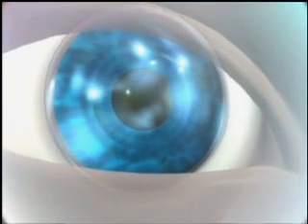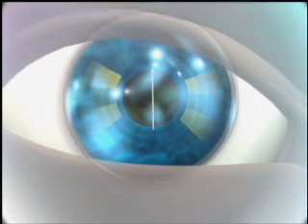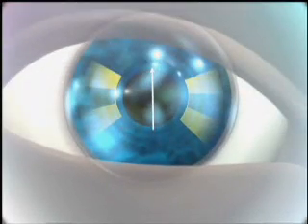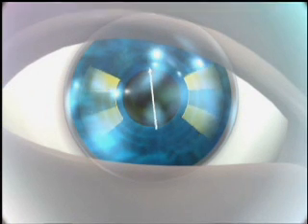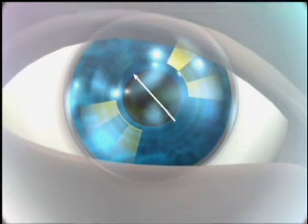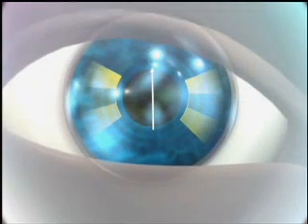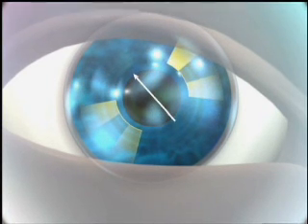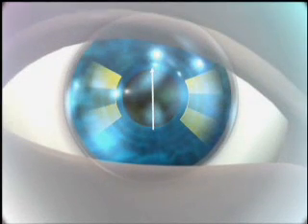Because of the unique placement of the thicker areas in this design, the interaction between the ASD lens and the eyelid actually increases stability. During a blink, the eyelid interacts with the lens in 4 specific areas called active zones. Because of where these 4 active zones are located, each blink actually squeezes the lens into place, even in extreme gazes or head positions. Should the lens be inserted incorrectly, the blinking eyelid actually helps to reposition the lens into place rapidly. This is the real breakthrough of this type of lens design.